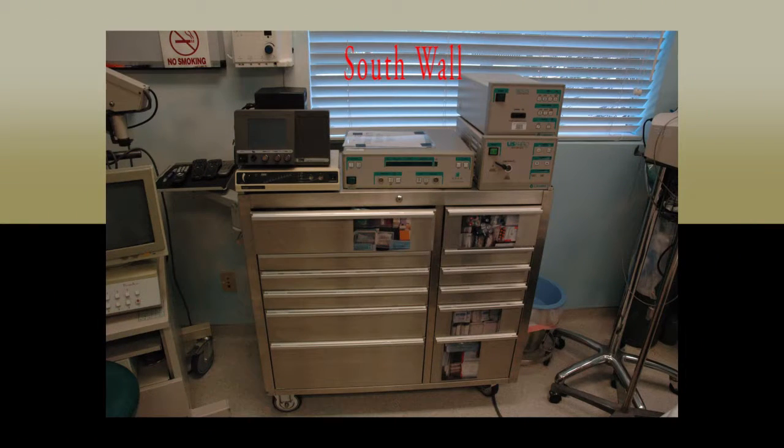Next to this is a surgical supply cart. This toolbox is where you will find all single wrapped instruments and smaller packs used in clinic. There are 6 wide drawers on the left and 6 narrow drawers on the right. Each drawer is marked with the specific equipment found within. We will now discuss the tools and supplies found within each drawer. We will begin with the wider drawers.